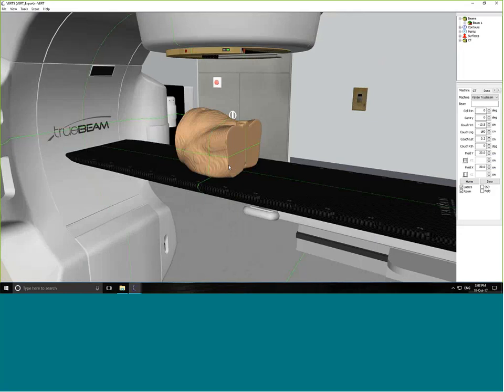So one of the reasons that we wanted to embed these plans is that they actually come with 4 days worth of CBCT data. So A, it means it's quicker to load it in, and B, it means you can flick instantly between the 4 daily sets of images.